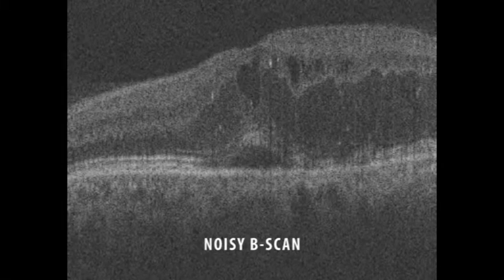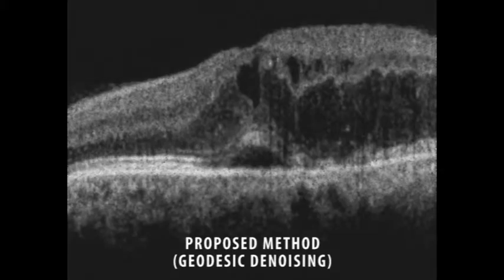macular edema. The poor quality of OCT images hides image features that are important for diagnosis and influences the accuracy of segmentation and pattern recognition algorithms. The proposed geodesic denoising is a patch-based method. It uses a global search and a two-stage denoising to find the best similar patches for noisy samples. The similarity of patches is computed based on a geodesic pattern that preserves structural information during denoising.